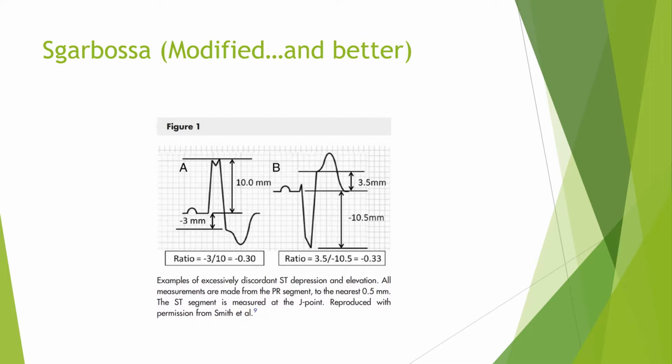And this can be applied to all of the abnormal pathologies, whether we're talking about left bundles, ventricular pacers, LVH, even PVCs, even VTAC to an extent. You could actually apply these rules. These rules apply to all of them. Even an ugly looking ventricular pacer rhythm has rules it has to follow, and these are those rules.